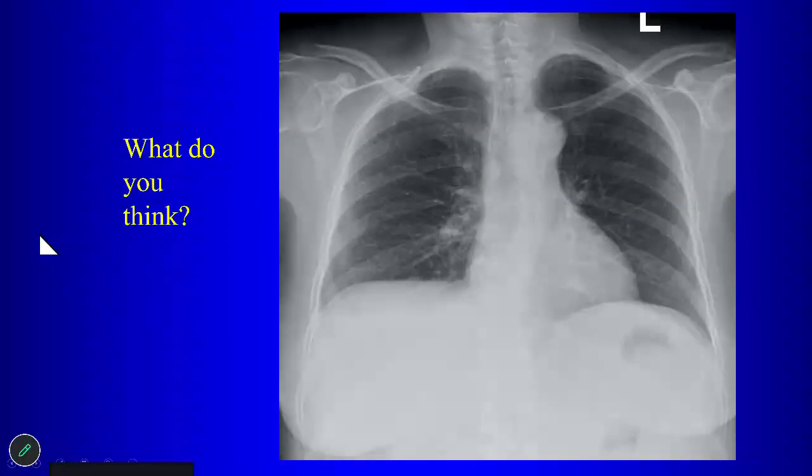We're here from India. All right. Anyway, so let's start with this chest radiograph. So, you guys at NBI, anything to say? Sam, do you have anything to say?